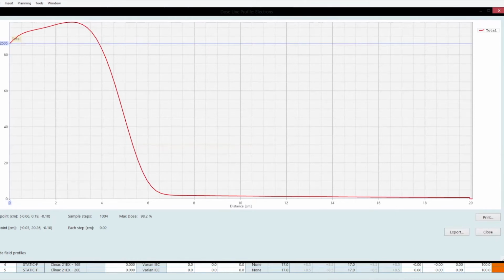That's why I say these general rules, 75, 80, 85, 90, and 95 for 6E through 20E. I'm increasing to Dmax. My Dmax point at this field is right around 2.8 centimeters, though within a few millimeters around that region I effectively have Dmax. So I'm starting to get a little bit of a broad plateau in the Dmax region.